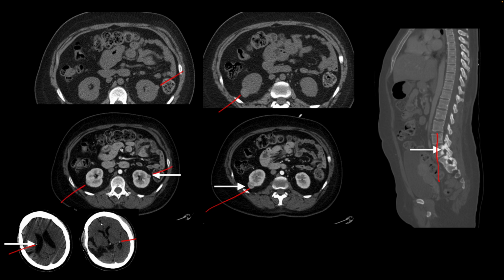And so these patients have renal angiomyolipomas, and they are very common in tuberous sclerosis patients. They are often multiple and bilateral. And it's not very clear in this patient, but they generally have fat in them, and they generally show contrast enhancement.